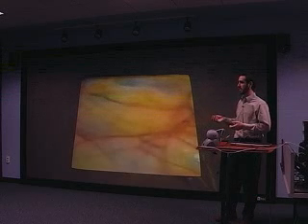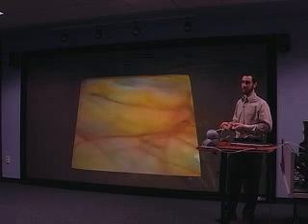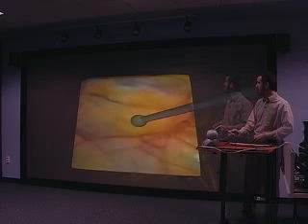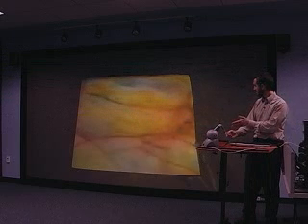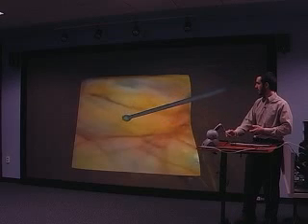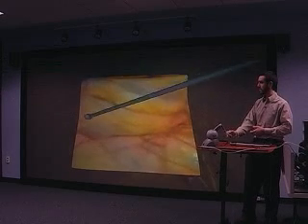What we're modeling here is an extraction task. So say there's a tumor or an organ that's malfunctioning that needs to be removed, like an appendix or a gallbladder or something like that. I can use that to interact. If I move over here, I can feel my hand is being stopped. Whereas here we have the surface, and then I can push against it, and you can see how the texture changes and deforms as I interact with it via the device.